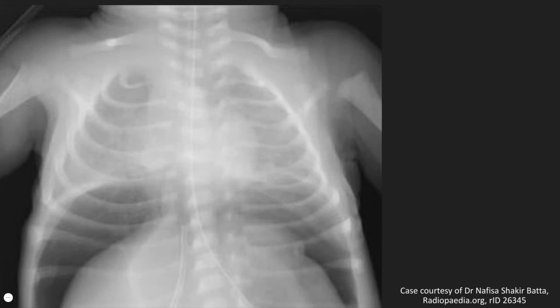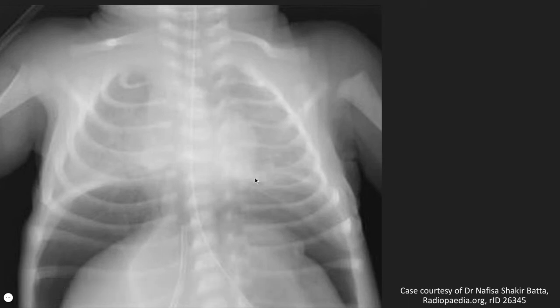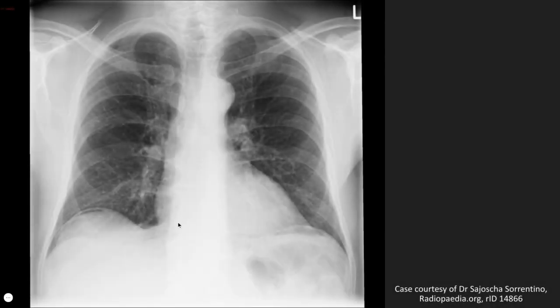This example shows gross pneumoperitoneum and also revisits the continuous diaphragm sign as we see it throughout its length. This example is far more subtle, showing just tiny crescents of air below the hemidiaphragms, and is the sort of case where having a system is more helpful.